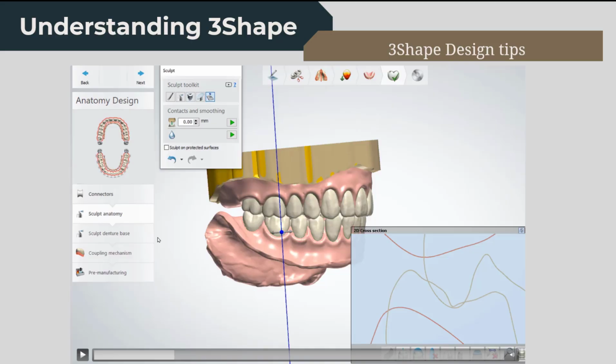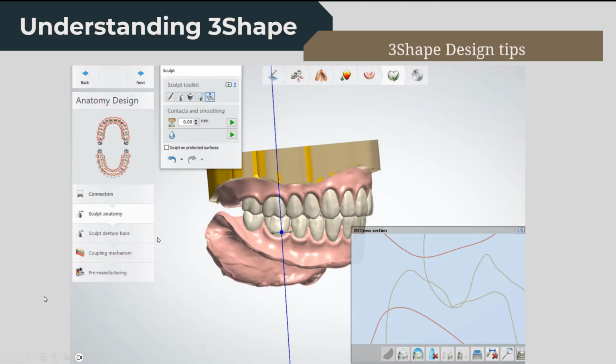But what you can imagine is we're not actually chopping out this exact shape out of this. What we're going to be doing is kind of pushing that shape into this. If you can imagine you have Play-Doh in your hand and you're pushing your thumbprint into it, it's still leaving the impression of your thumbprint, but it's not actually chopping out a perfectly sized version of your thumbprint to rest inside of. And also, additionally, if you look here, these little arrows on the left side of the screen are pointing to which arch we're working on.